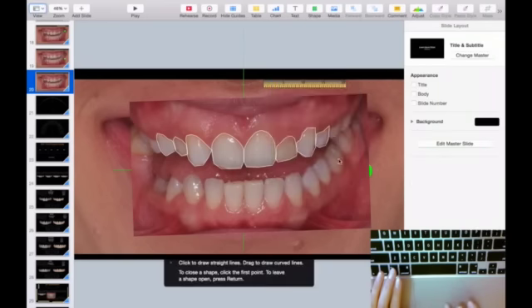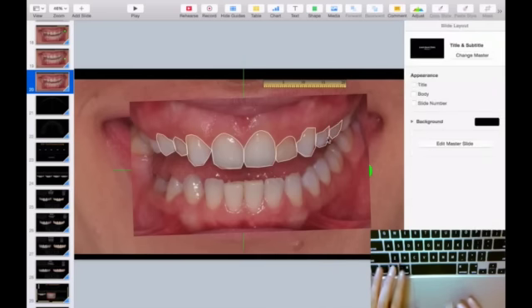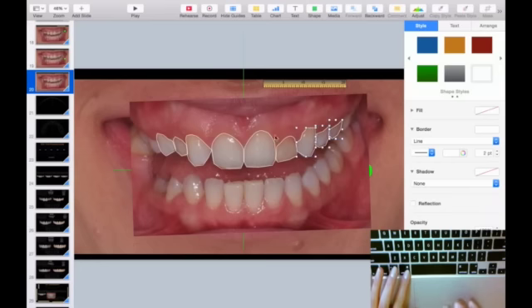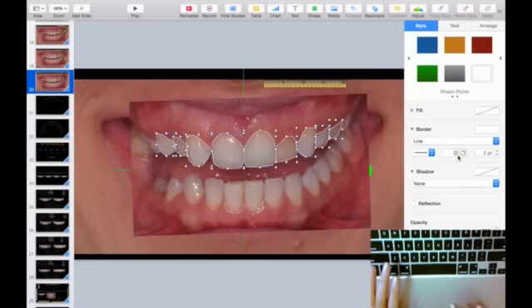And one more. And let's go back one. Now I'm going to get all of them. And I'm going to go to style and the line, and here's the color. I'm going to turn this and I'm going to make it thicker, okay, the line.